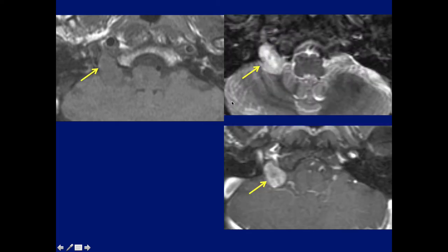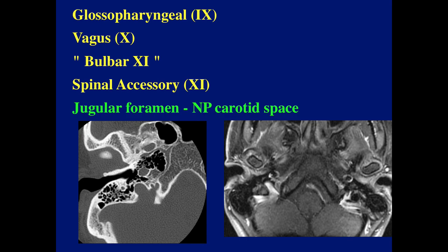And what structure is involved? Correct, as Nate and Anshu and Gino said, and Ben, the right side, and as Gino said, the region of the jugular foramen. And here's the enhancement of the lesion in the region of the jugular foramen. Let's talk about the jugular foramen.